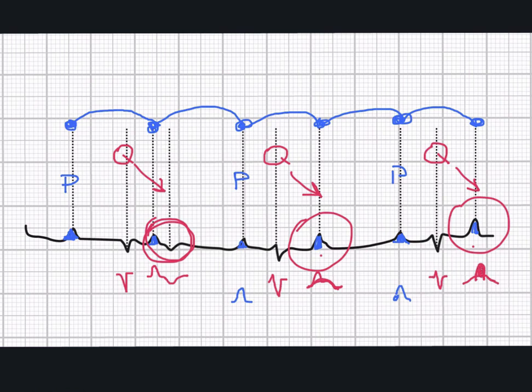This is a very difficult case. And it is very rare that we have this superimposition of T and P waves, and I'm sure as long as we go along with the tracings you will get better and better.